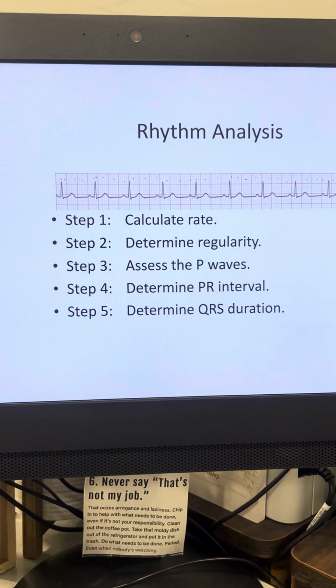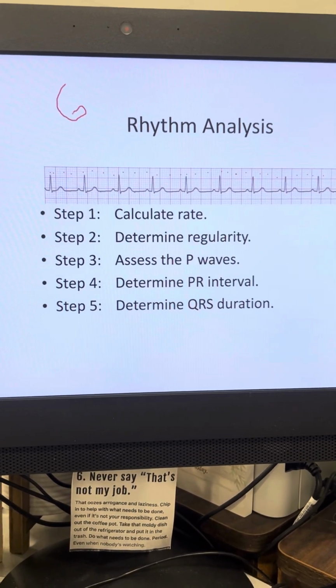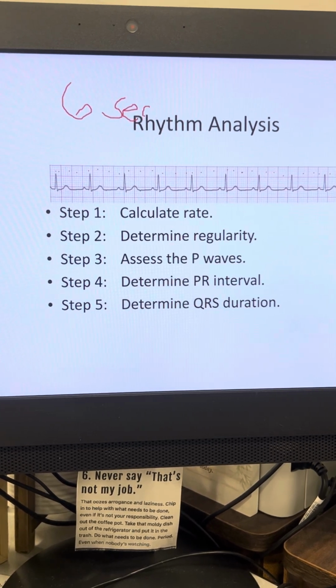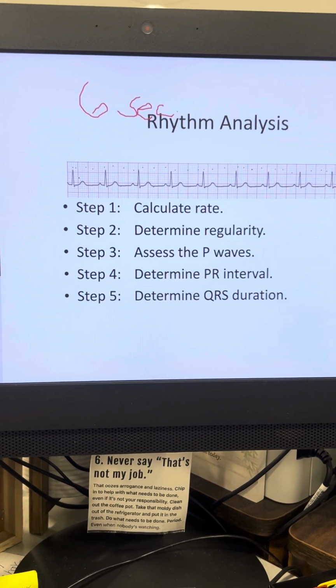So this is 30 boxes, which is a 6-second rhythm strip, okay? So I'm looking at a 6-second glimpse of the heart, if you will.